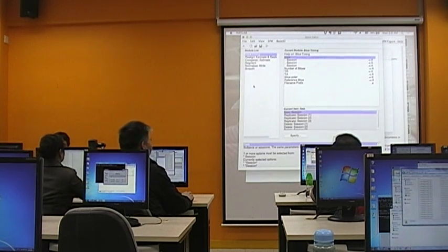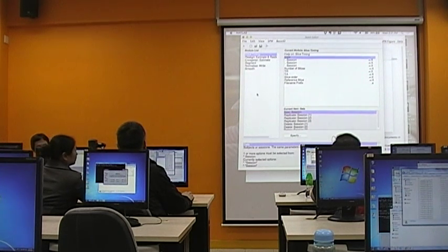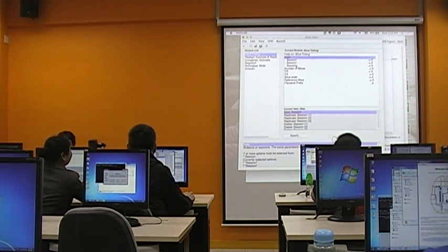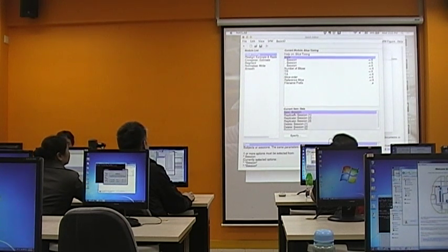So I just go back to the pipeline, just to refresh your memory, or if you're not here on Monday, we will quickly go through what exactly you need to set. For slice timing, we have 3 sessions, remember? So we click 3 times so that there are 3 separate sessions.